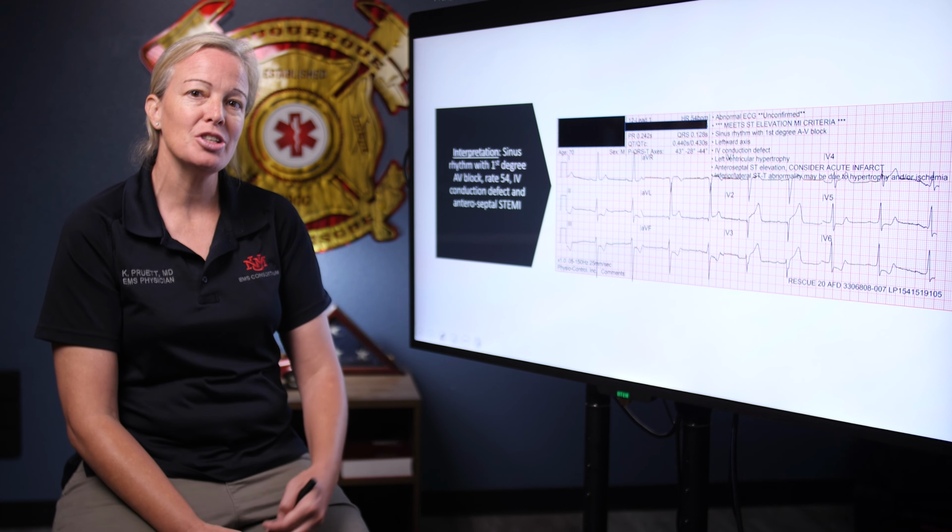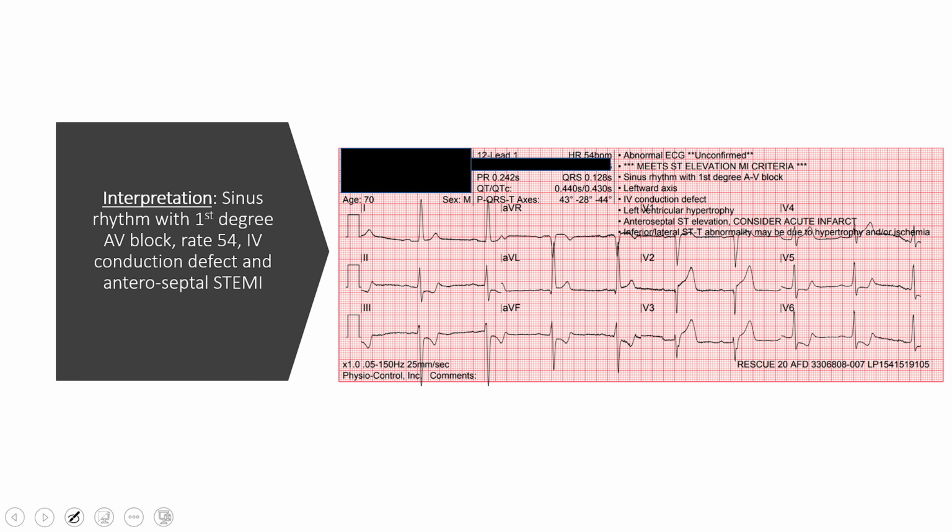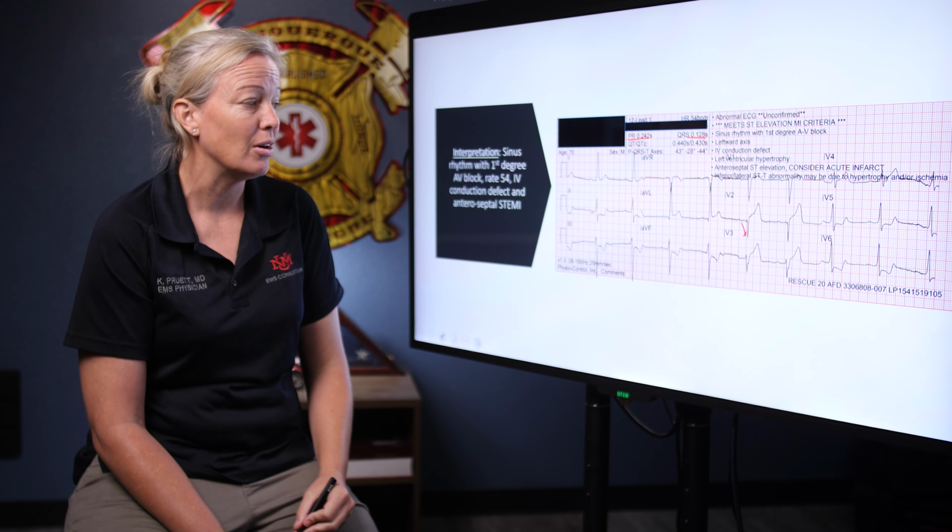And then here's one last look at our 12 lead. What we have is a sinus rhythm with a first degree AV block, because we got that long PR. Leftward axis, slight interventricular conduction delay, and that starts to make sense, right? Because we have a big STEMI that's infarcting those conduction pathways, and so we're starting to see signs of conduction delay with our long QRS here. The other thing that we're starting to see, and I didn't really get into, is these Q waves here. This means that some of the tissue is already dead because he waited a little while to call.